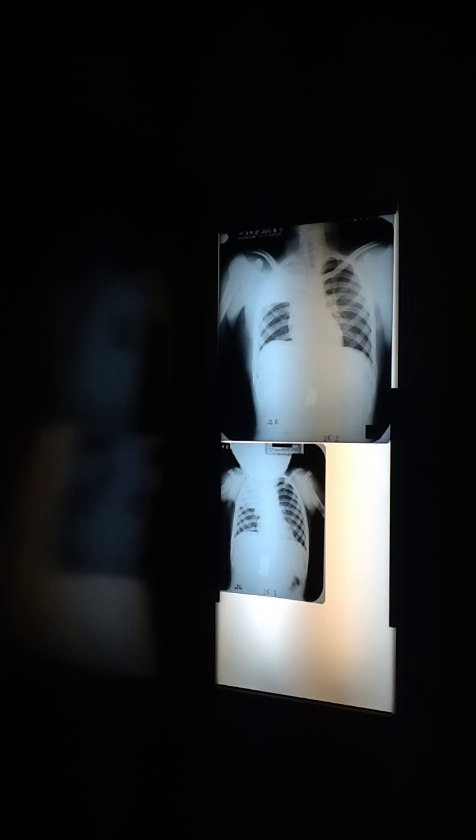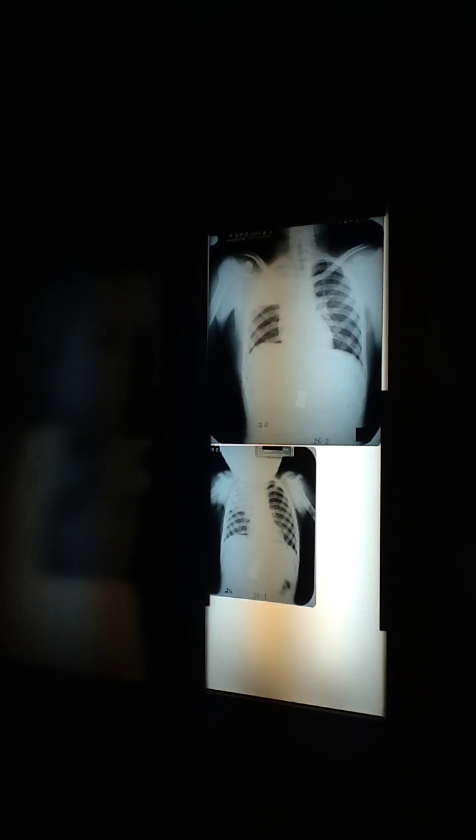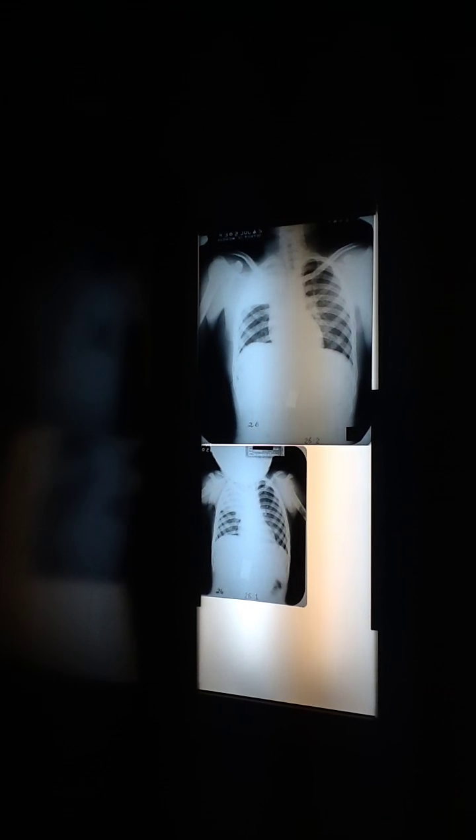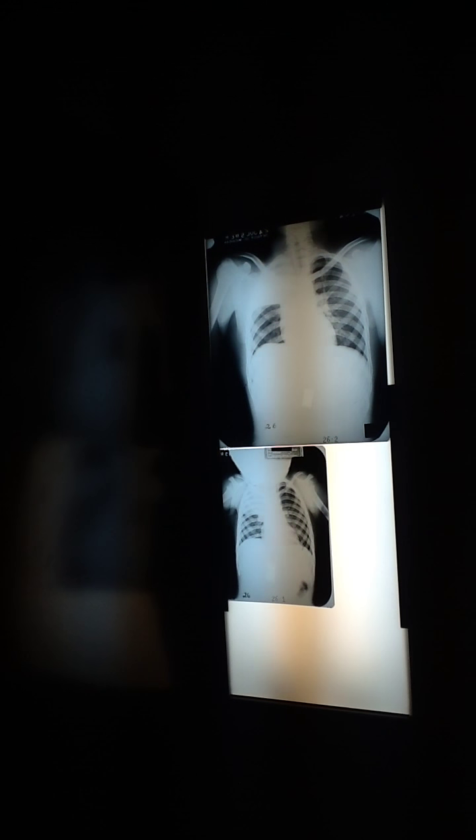So this, since the physical volume of the lung didn't change, is this a replacement problem, meaning replacing the air with something else, or did we just remove it and not replace it? It has to be replacement, doesn't it? Because if it was removal and no replacement, the volume would change. And the volume didn't change. So this is airspace consolidation.